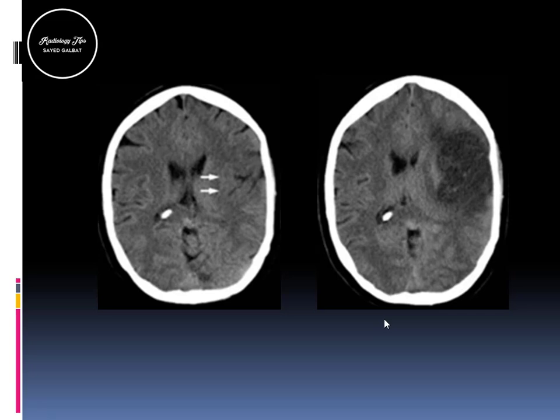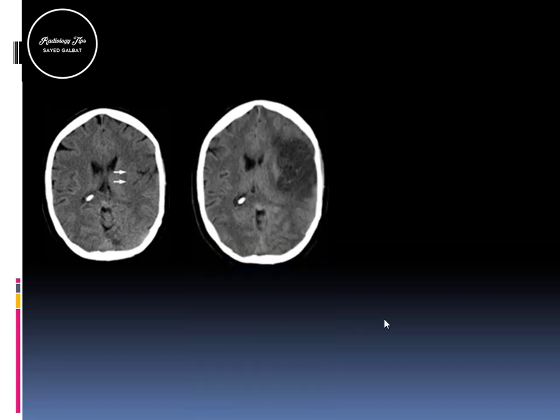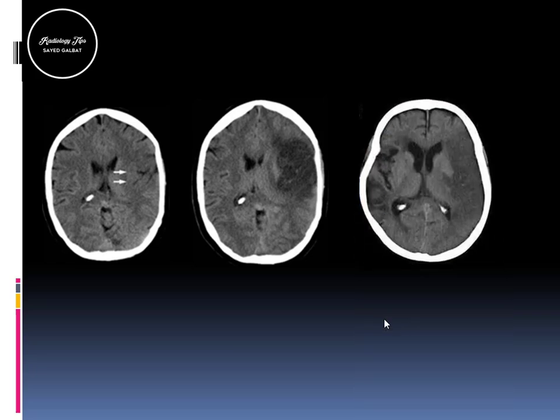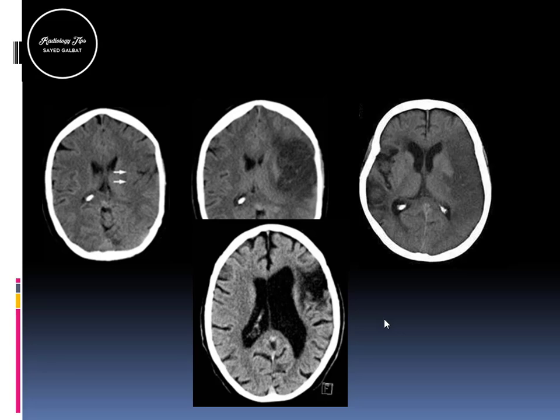That means that the imaging feature of the infarction will differ according to the time of acquisition of the image in relation to the presentation of the patient, right? If we want to arrange all these pictures chronologically, we'll start with this one, in which you hardly appreciate the infarction, and this is the hyperacute stage. Then the acute one, where you can see the hypodensity and settled infarction. Then the subacute one with diffuse hypodensity and effacement of the sulci. And lastly, the chronic one with encephalomalacia and gliosis and CSF-like density with negative mass effect.